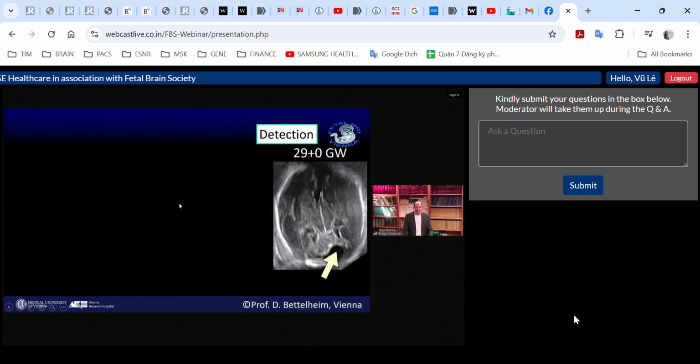Now, coming back to the situation Karina has shown you, and I think it's a very important point Karina has made, is how are you describing fetal asymmetry or fetal cerebellar asymmetry? Are you calling it hypoplasia or atrophy? And I think both terms are not applicable here. This looks clearly like a defect. And it's like something has been bitten out of the cerebellum. So this is some classic defect here, and this is at 29 weeks.